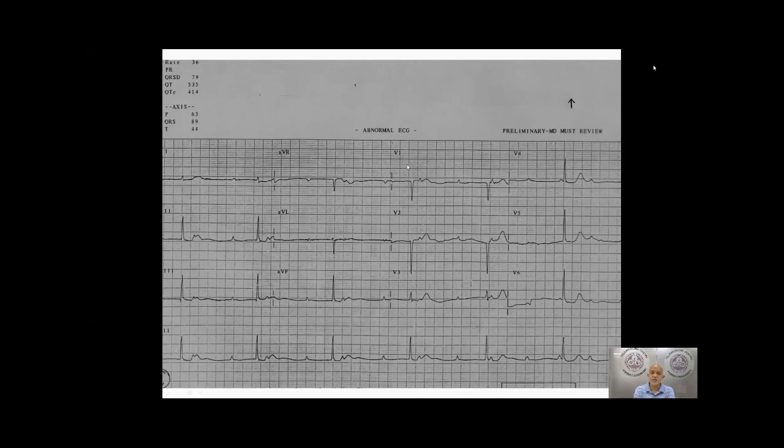Important to remember that normally we do not see Q waves in lead V1. Normally small Q waves are present in V5, V6. If there is presence of Q waves in lead V1 and absence in V5, V6, along with CHB, it would indicate the patient has ventricular inversion, and with CHB it is very strongly suggestive of congenitally corrected TGA.